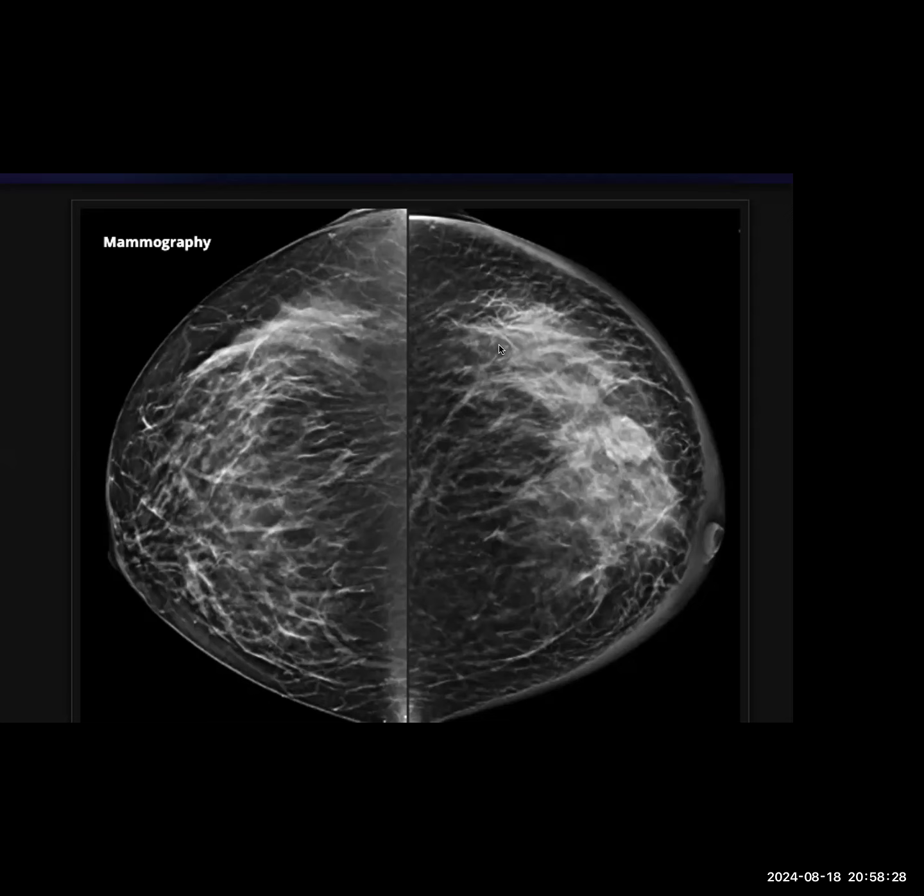I'm looking at the margins. The margins appear spiculated, and I'm trying to look at calcifications. In my routine practice, I would look at the magnified view or with a magnification glass. In the cranial aspect, I can see foci of punctate calcifications. Other than that, I'm trying to look at lymph nodes. I don't see any obvious lymph nodes. I would also look at mediolateral oblique views to look at lymph nodes and chest and pectoral muscles.